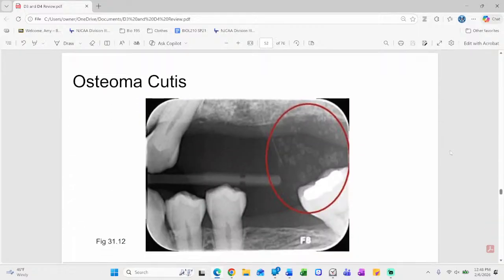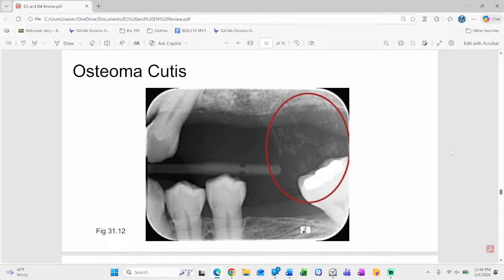All right, here's osteoma cutis. I know many of you have not seen it on patients. You're only going to see it in the cheek area, because this is all going to disappear when you have teeth. It's all going to blend away. Long-standing acne turns small areas into bone, hard areas inside the skin of the cheek. Here's your soft tissue covering the maxillary ridge. This is soft tissue here, but all these little guys are those ossifications within the skin, osteoma cutis.